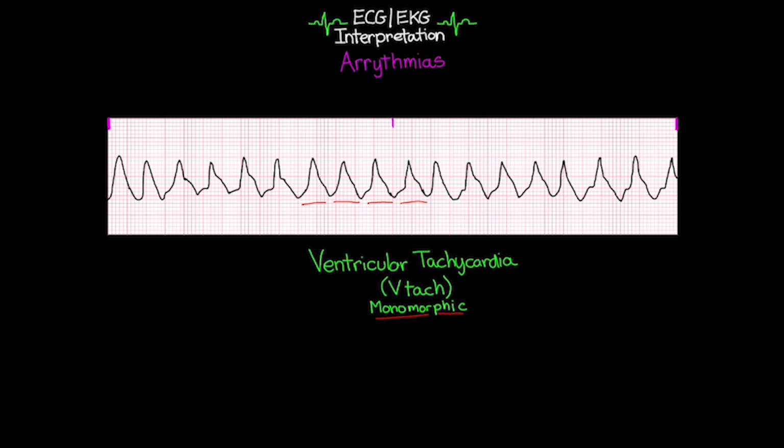As you can see, each of these ventricular rhythms are basically about the same, telling us that this is originating from the same spot. Now with VTAC, this has the potential to be a very serious thing for your patient. You can find a patient who still has a pulse and still is awake and talking while they're in a slow VTAC. But probably more common of what you're going to see is a patient who's pulseless, and therefore this is potentially a lethal rhythm.